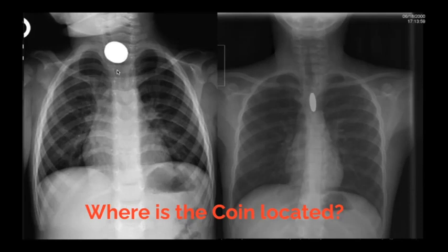Right. There is basically no need to do a lateral radiograph, because from the frontal radiograph we can already postulate where the location of the coin is, and then we can always direct the surgeon or ENT on which part of the structures they should scope first, right?